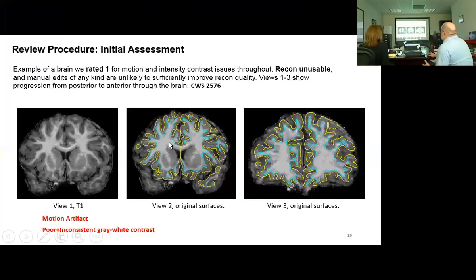So how do we make the pial bigger? To fix an exclusion error that you see here is to make the white matter bigger, to make more white matter, or more voxels labeled white matter, and there's not a real good way to do it. You could probably fix a little bit here. There might be a place where we could do something, but given the scan quality, this is a little bit more interior, where the gray-white contrast is even worse.